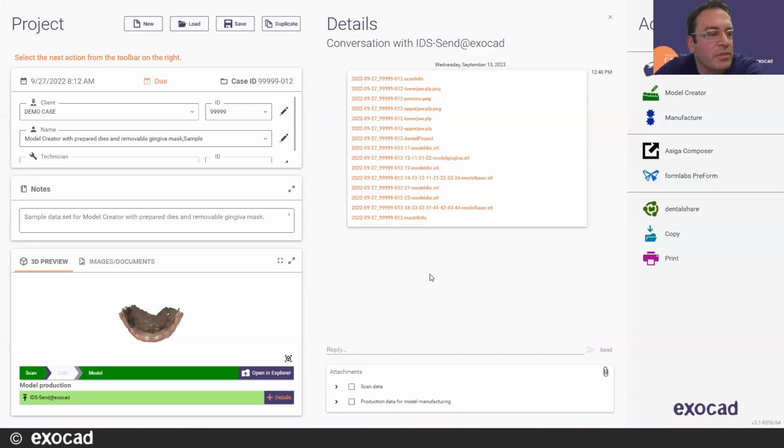So for single tooth workflows, those have been brought to the forefront. So instant anatomic morphing's on right away. For multiple unit cases, it's still in the advanced tab. That might change if we get enough feedback to change that for multi-unit cases. But yeah, that's how that works.